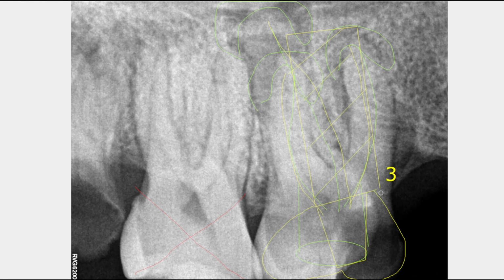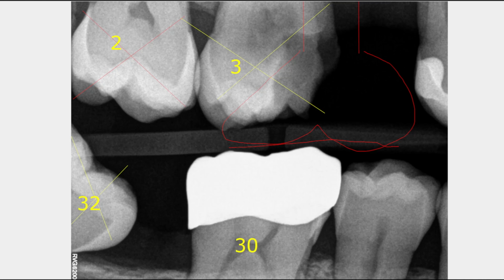So there's my little crude drawing of the implant. Make sure you put the abutment in there so they know that it's two pieces. Make your general dentist's life easier. And then we went over to the bite wing. And this is where we came up with kind of the better idea.